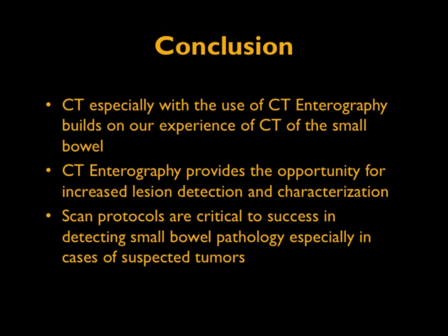As I showed you, these lesions are small, often vascular. Good distension with IV contrast is critical. So again, protocol, how we look at the images, and how we interpret the images are all critical.